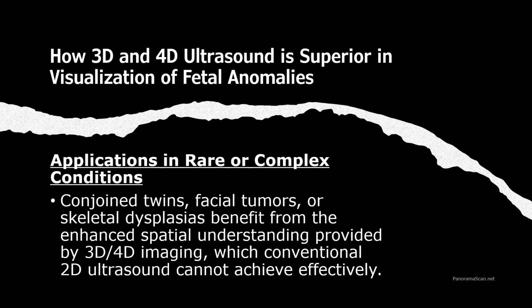In facial tumors, the precise imaging provided by 3D ultrasound allows us to evaluate the tumor size, its location, and potential impact on the surrounding structures. Similarly, in skeletal dysplasias, 3D and 4D ultrasound imaging aids in assessing the complex skeletal malformations that may be missed or less accurately portrayed in 2D.